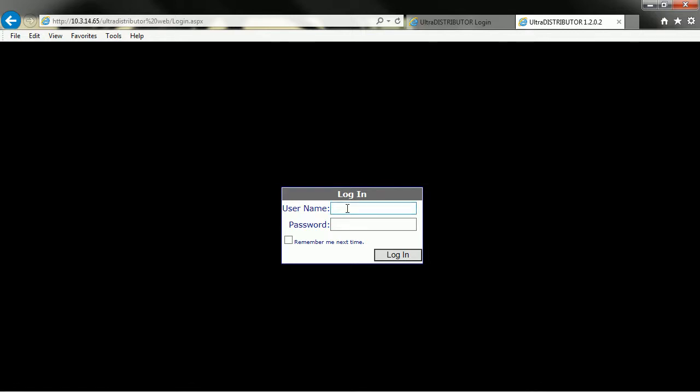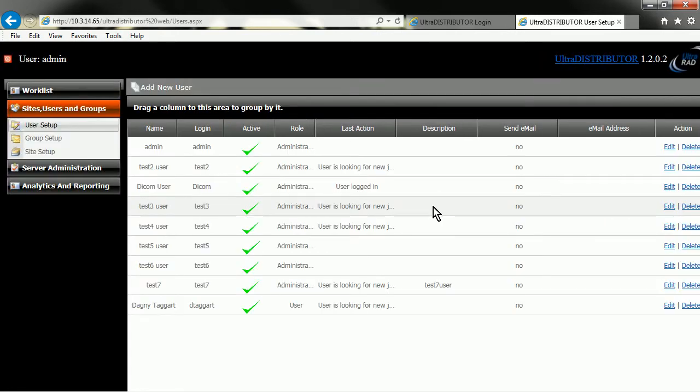In this video, I'm going to demonstrate how to configure and set up UltraDistributor. So I'm going to begin by logging in as an administrator. This would be a system administrator that's going to set up a new account for someone that's able to send and receive HL7 through UltraDistributor, which of course alleviates the need for having to use VPNs.